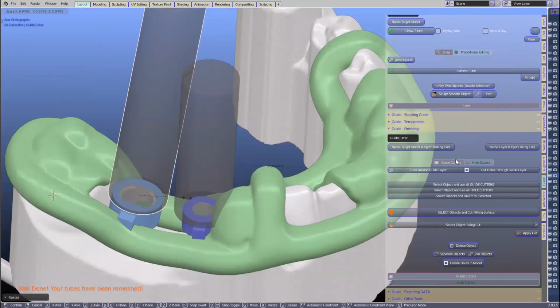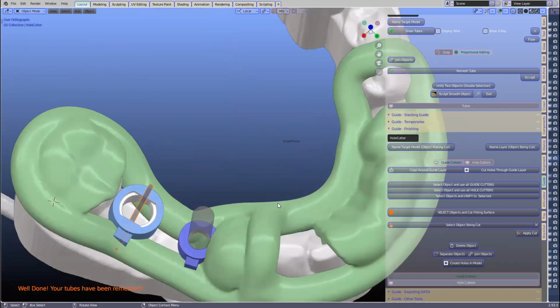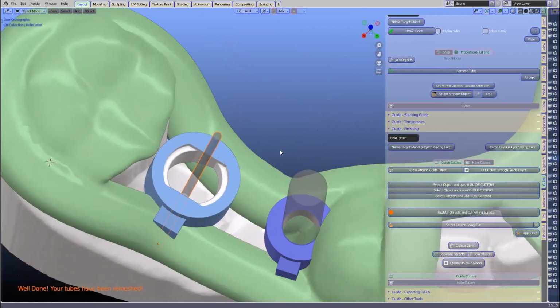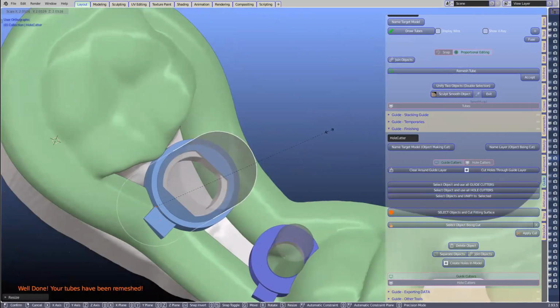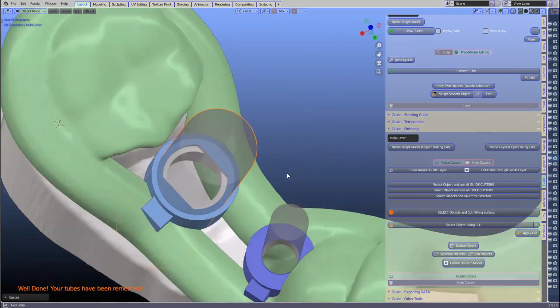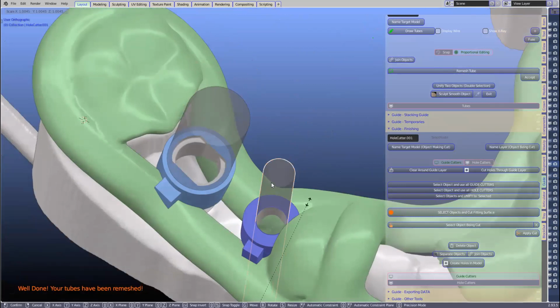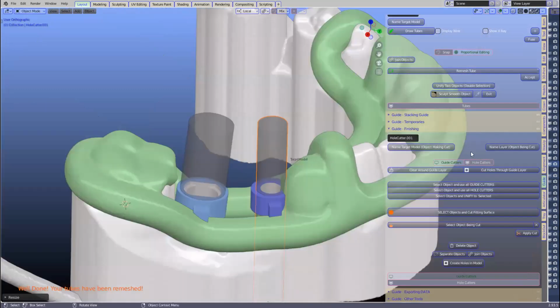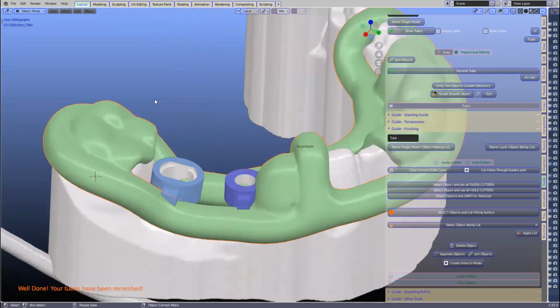Then I'll just hide the guide cutters and expose the hole cutters. Now this hole cutter was very small because that's the initial one that we were working on. So S to scale, I will scale this beyond something like that. Okay. So the interaction between the cut here is only the green guide and the cutting tool. So don't worry about it. It's not going to cut anything else but the actual green guide.